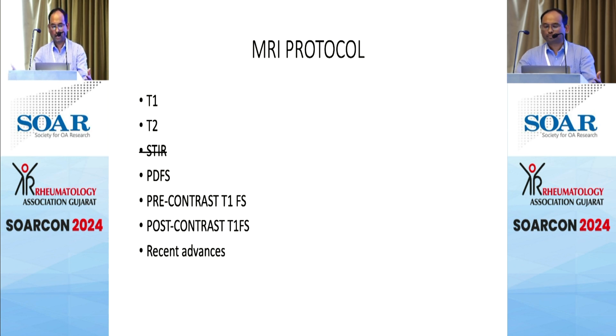So STIR and PDFS, which is proton density fat suppressed imaging, are the two sequences in which I will be showing you images where fat is suppressed, and you will see all the abnormal things as bright. It is not an umbrella term, but yes, it is.